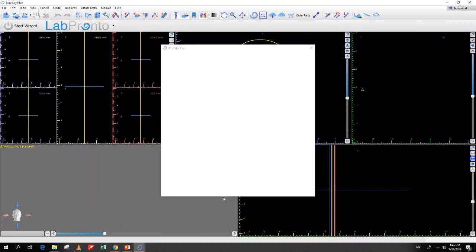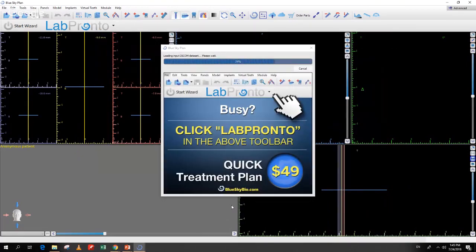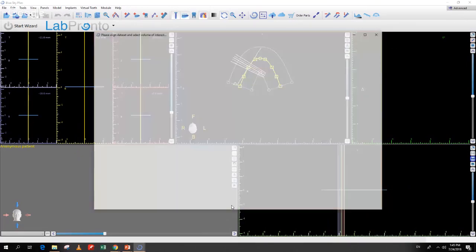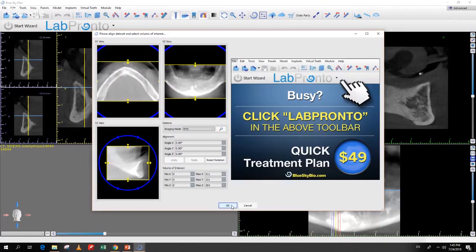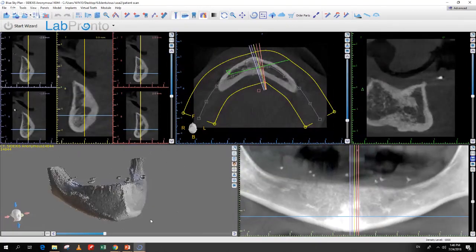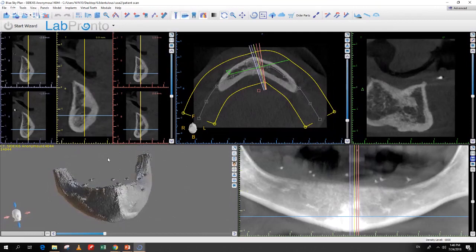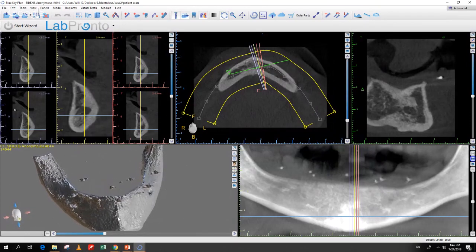The process flow of importing DICOMs was explained in more detail in the past, including the shortcuts, the different ways of importing, and the different capabilities the software has to import zipped and unzipped, compressed and uncompressed DICOMs. That's all been covered, so we're going to move quickly through this process flow. Now we've imported the patient's scan together with the markers.